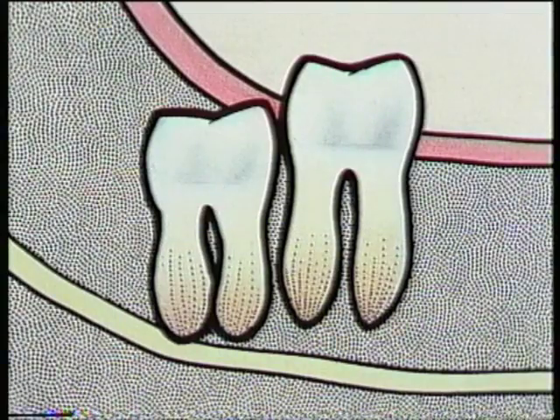Here's another variation on size and shape. The disto-angularly impacted third molar here has two separate roots, which are not long, but their problem lies in their shape, which is excessively bulbous, as the greatest diameter exceeds that of the crown.